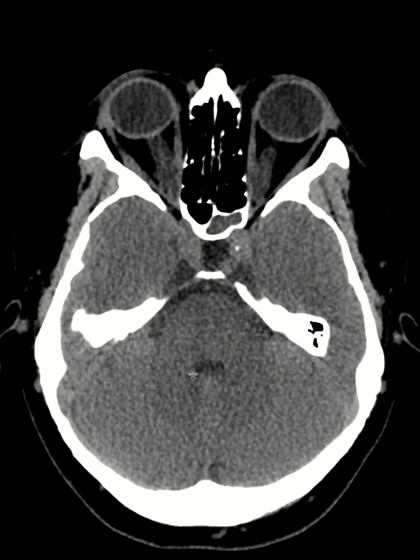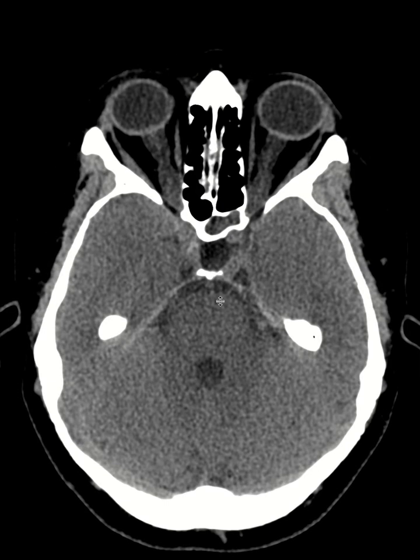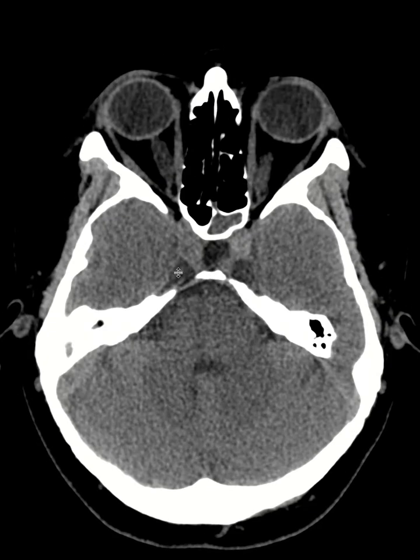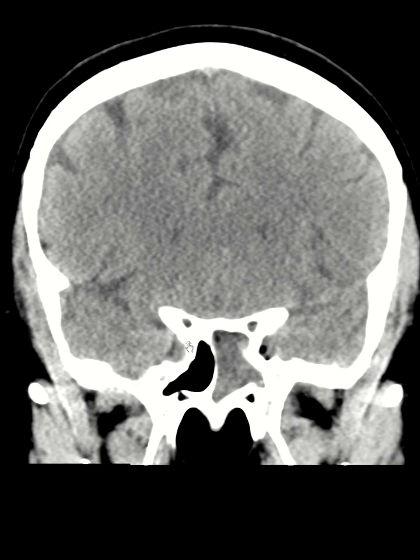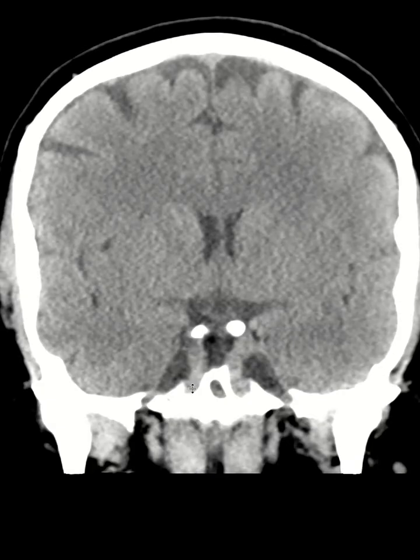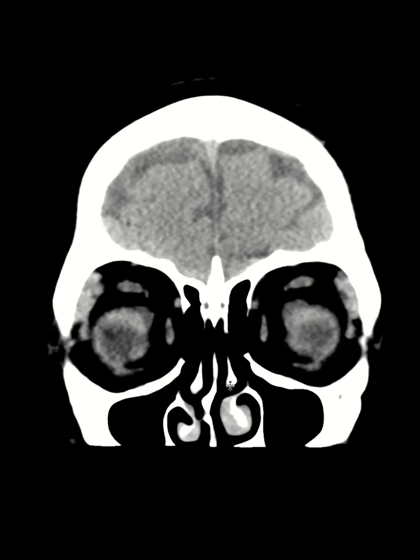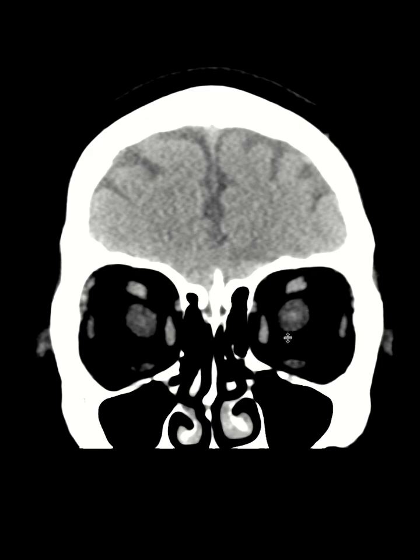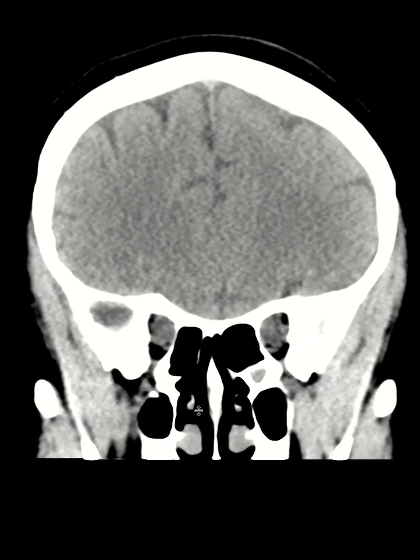Okay, so now I start looking at this. I see the huge sella turcica and partially empty sella appearance, and I also see an enlarged Meckel's cave right here. Okay, let's look at other views. If I show you the coronal reconstruction, you see that this patient has a huge partially empty sella. This is a very unusual appearance for a 40-year-old, and again, if you look at the orbit, you see that the optic nerve sheaths are hugely prominent. They are very dilated. There is prominent CSF in the optic nerve sheath.